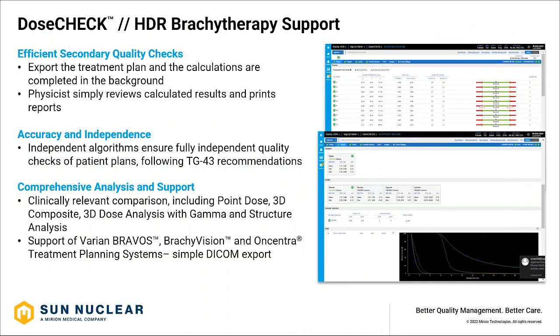In addition to performing independent photon and electron secondary dose calculations in DoseCHECK, you would also be able to do secondary dose calculations of your HDR brachytherapy plans.